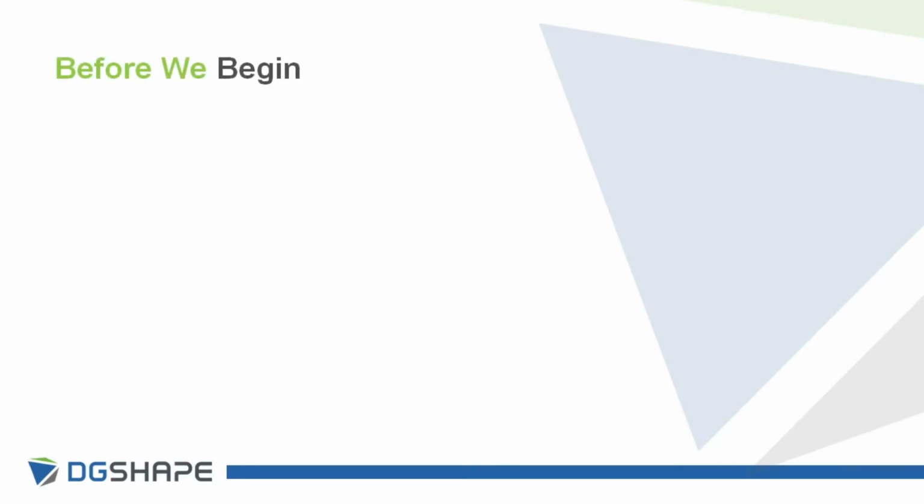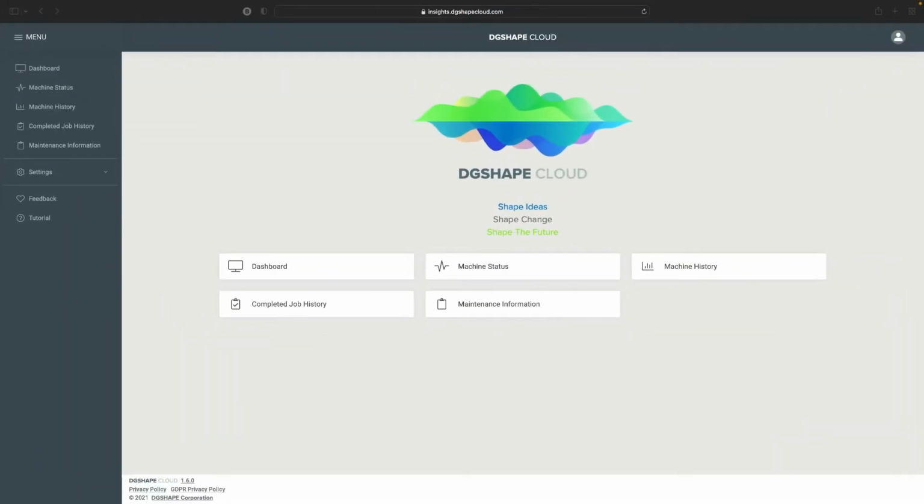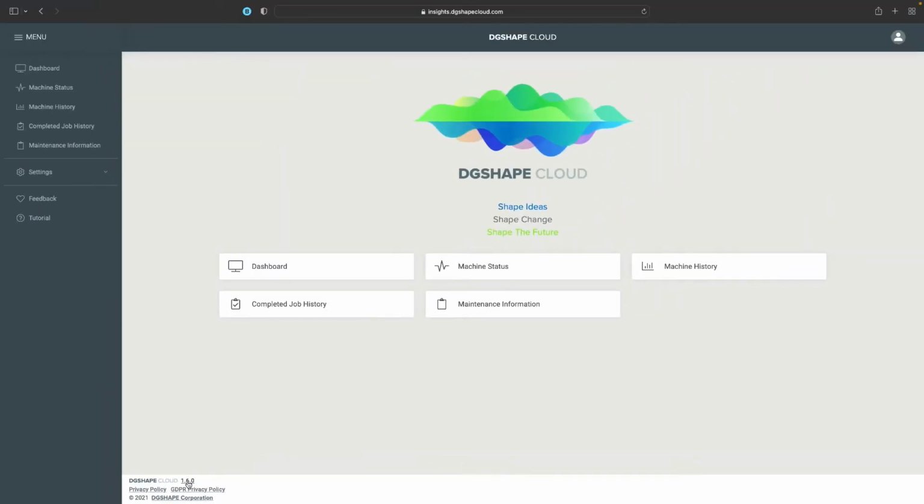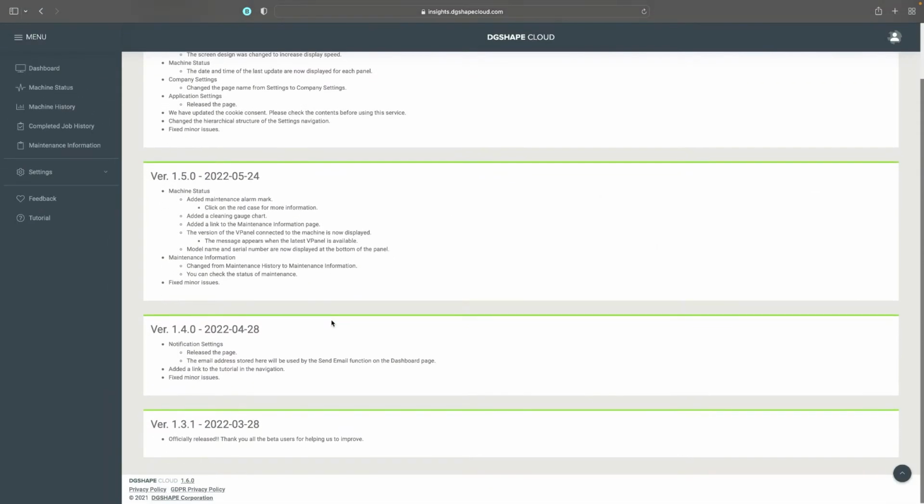Before we begin, let's do a little housekeeping. During this presentation, I will cover the features available for DGSHAPE Insights Release 1.6.0. If you are watching this video and notice some features or panels are different in your version, it is possibly due to an update. In this situation, check the release notes in Insights by clicking on the version link in the footer of the main screen.